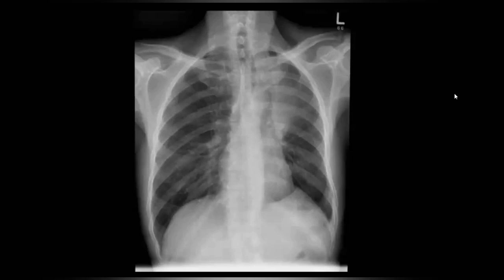Regarding the hila, the right hilar region is normal, but the left has some opacity within it, maybe because of the pathology lying over here. The apices and the remaining areas appear unremarkable. I cannot appreciate any pathology beneath the domes of the diaphragm.